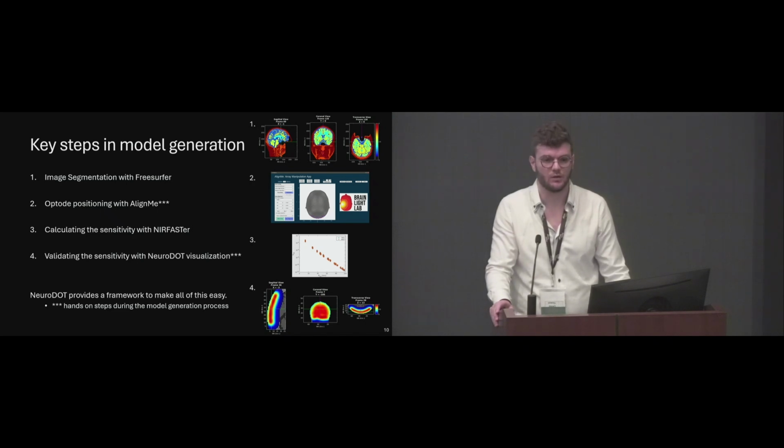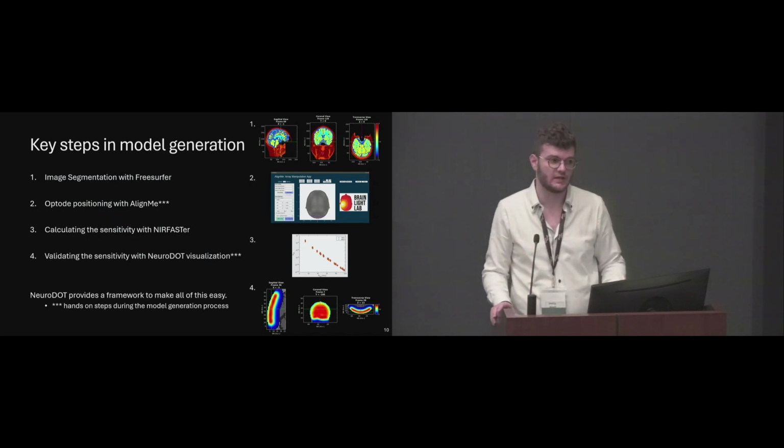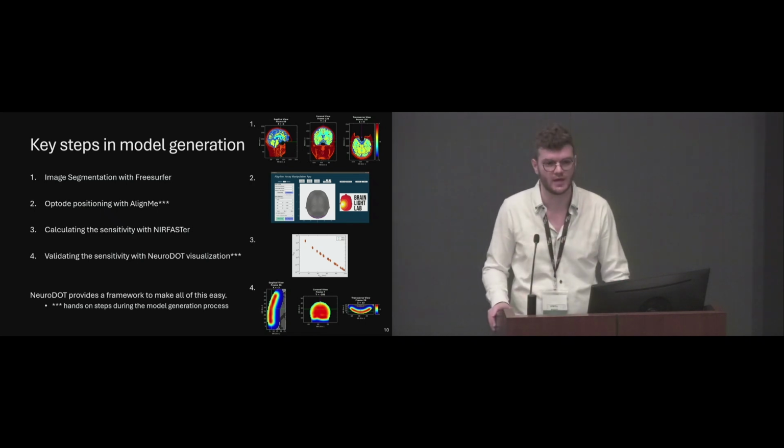For example, I've done some pipelines where we auto-register a digitizer probe array to the head, and for that we do need to use the Nasion and Inion because we're aligning everything in that sense. Additionally, if you're scaling the mesh to participant-specific values, you will need those landmarks in order to generate the affine matrix to go from your atlas to your participant-specific values to stretch and transform that mesh. Okay, thank you. No problem.